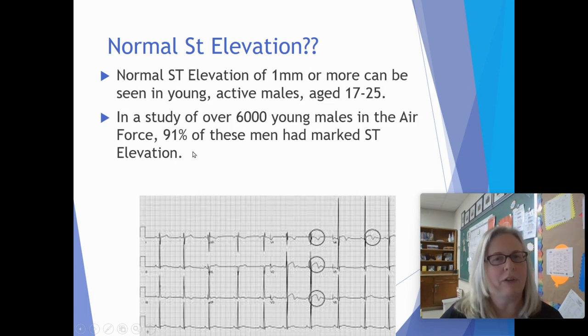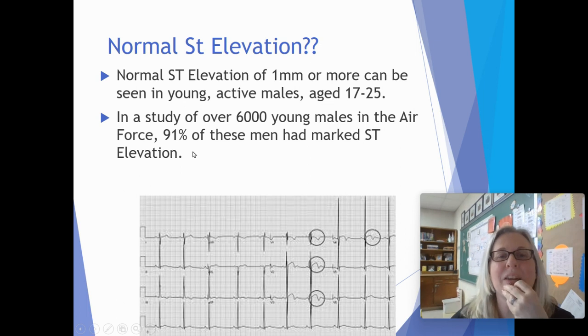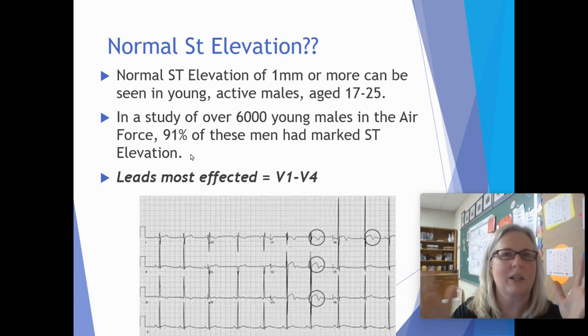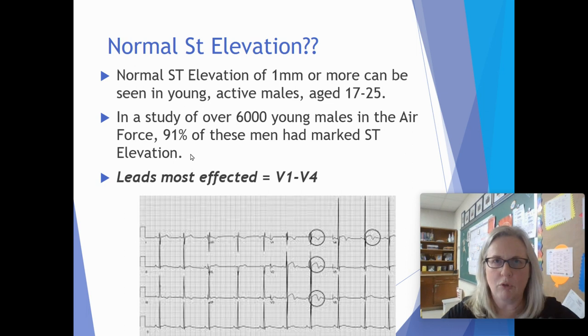They did a study of like 6,000 young males that were in the Air Force, and 91% of these men, that is a lot of them, had marked ST elevation. It typically affects leads V1 through V4. Okay, so these are young athletes that are running a lot. In boot camp, they run and they exercise and do the ropes courses and all kinds of other stuff. So they're very active. I do see this a lot in my teenagers here at the school.